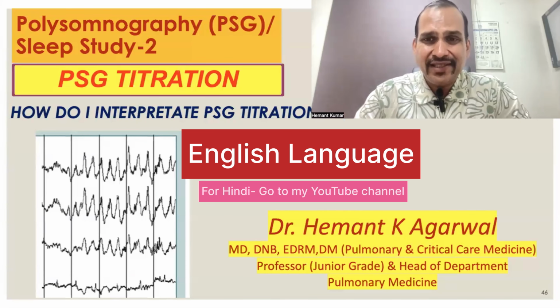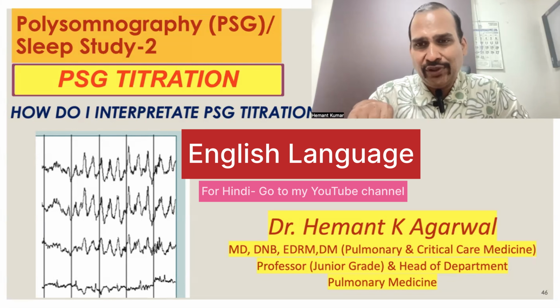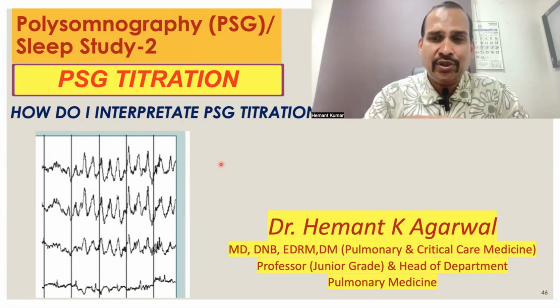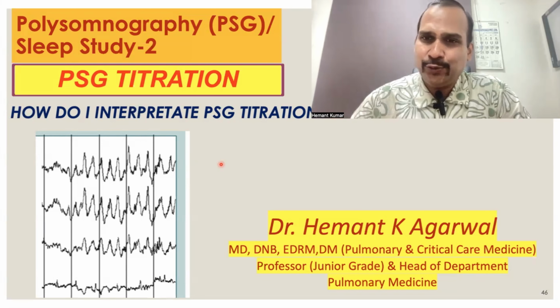Hello friends, in the previous video I showed you the sleep report of one patient. For the same patient we did a titration study also. So in this lecture I'll discuss the titration report of the same patient, how to report it, and what parameters we should mention in our titration report.